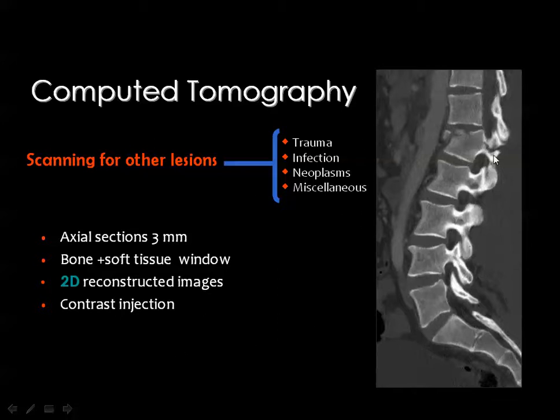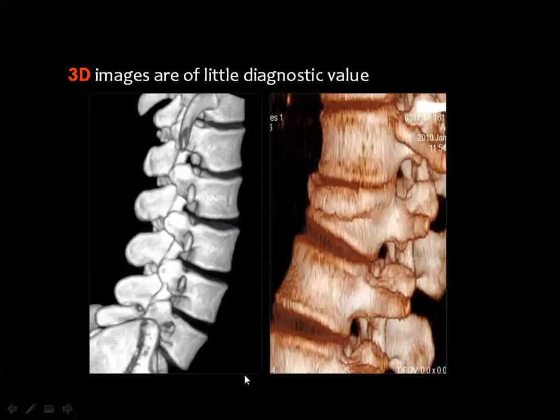And here you see a fracture at the level of L1 vertebral body with depression of the superior endplate, and the fracture is extending into the pedicle and the neural elements. I will discuss this in detail in the lecture of spinal trauma. Also, you may be able to have the 3D images of the scanned segment of the spine, whether in color or without color.